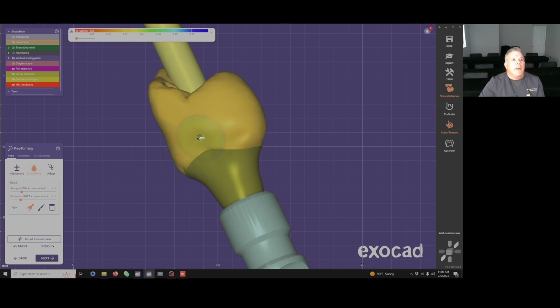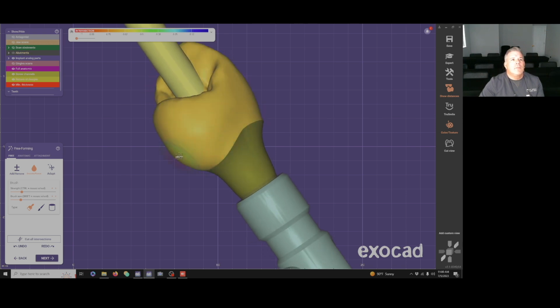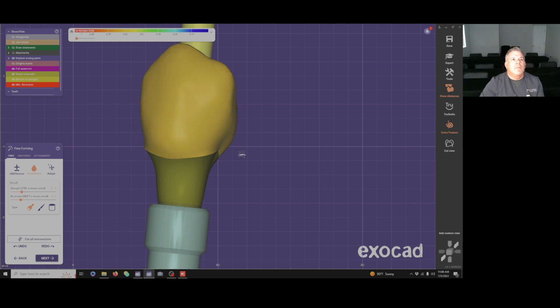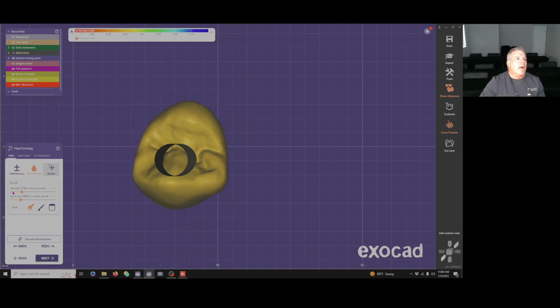Smooth that real quick. Okay, that's better. All right, so we're going to go ahead and hit next.